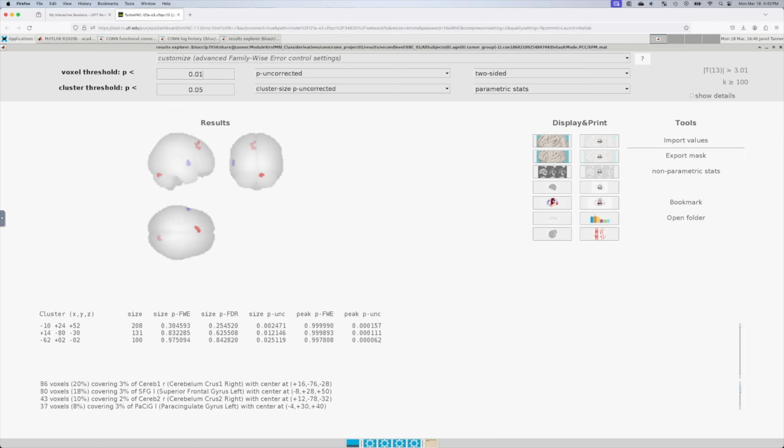If anything, this is the type of data that you would use to argue for a grant to get more data to be able to see if there's anything there. But for our purposes, we're seeing these few spots. So anything that's red, we'll want to look at these directions.